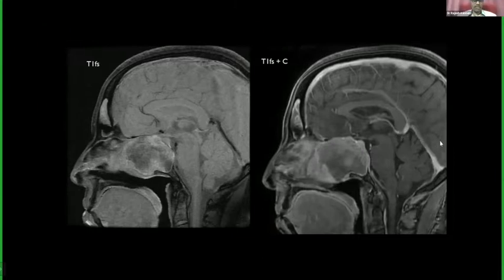Suppose the lesion is appearing so bright on T1 weighted image, and visually sometimes it's difficult to say whether it is enhancement or not. Is there any other method where you can demonstrate the enhancement? If someone says that both appear bright, how can we say that it is brighter on post contrast?